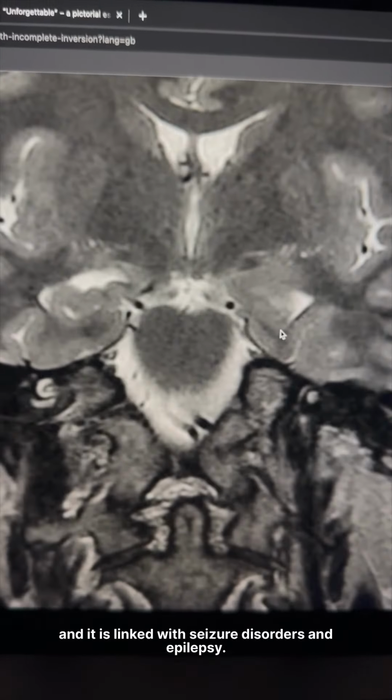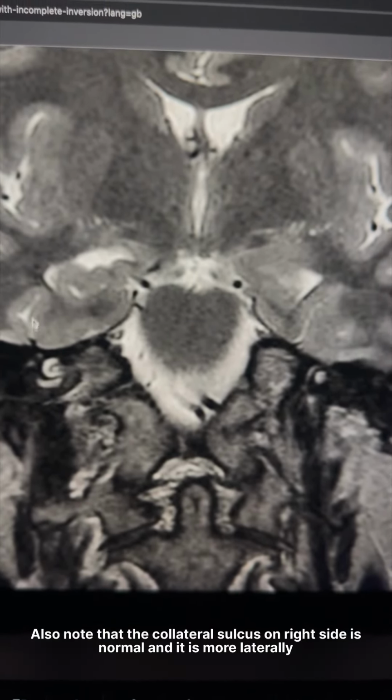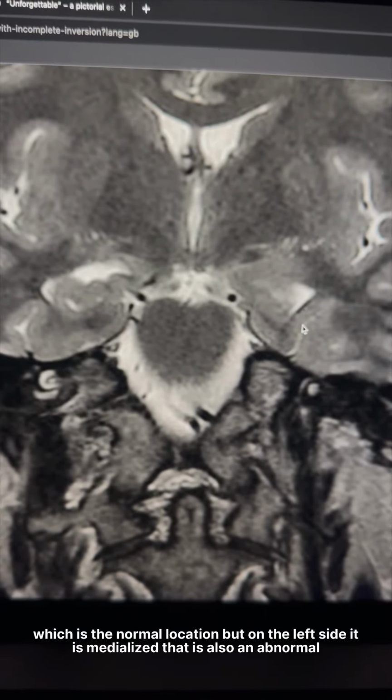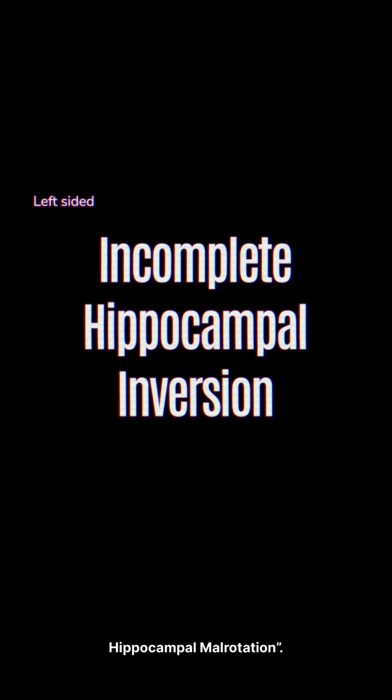seizure disorders and epilepsy. Also note that the collateral sulcus on the right side is normal and it is more lateral, which is the normal location, but on the left side it is medialized. That is also an abnormal finding. Therefore, the diagnosis in our patient is incomplete hippocampal inversion or hippocampal malrotation.